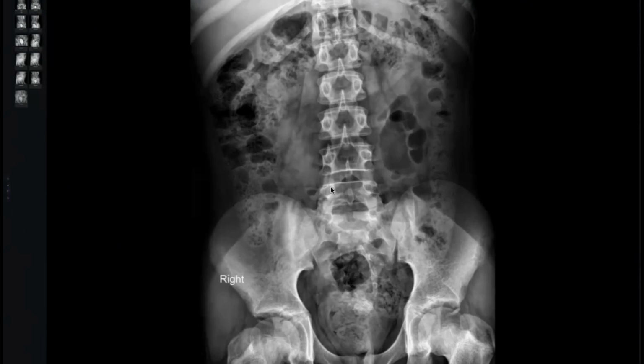Excellent. S1 vertebral body. I do not see it. Spinous process at the level of S1 probably. So there is a defect at the level of S1 vertebral body. So what's your diagnosis? So this is a spinal dysraphism with neurogenic bladder leading to vesicoureteric reflux.